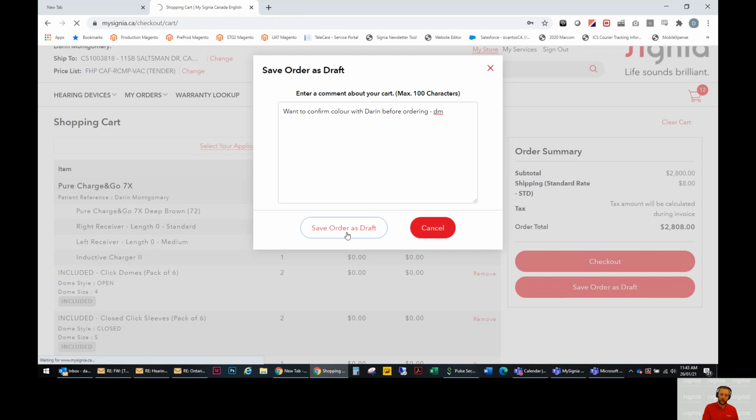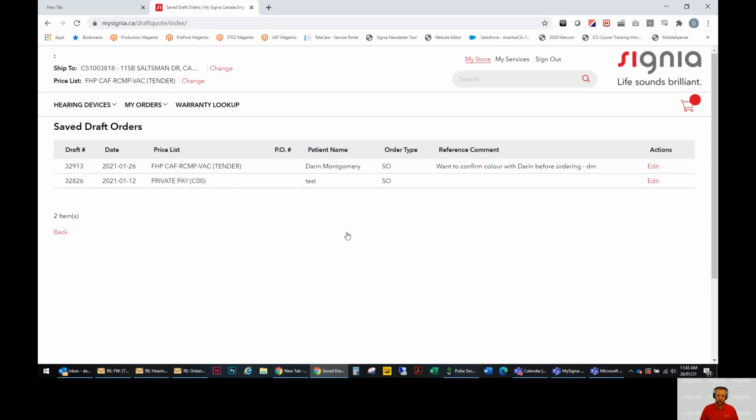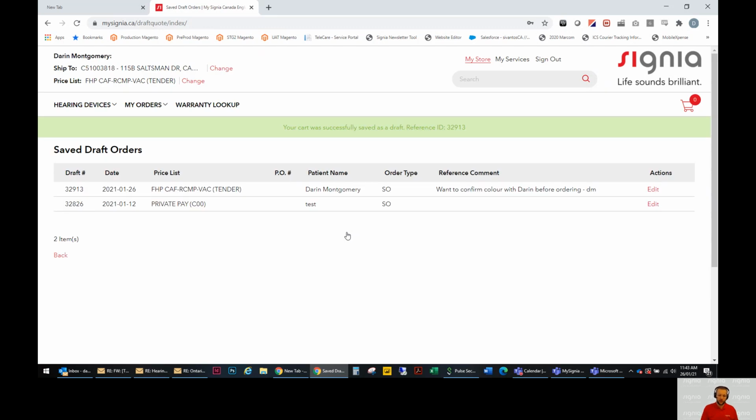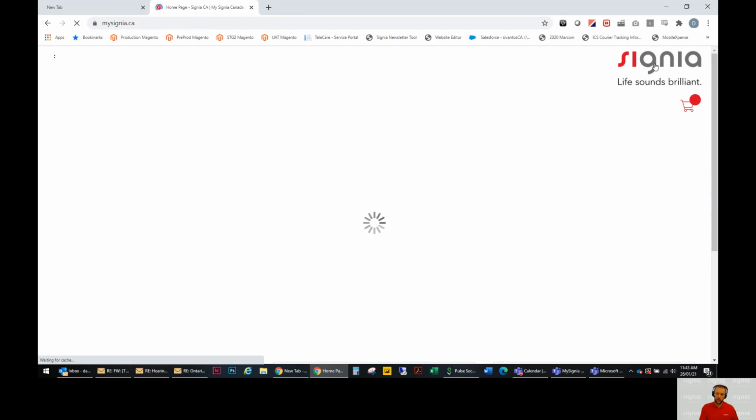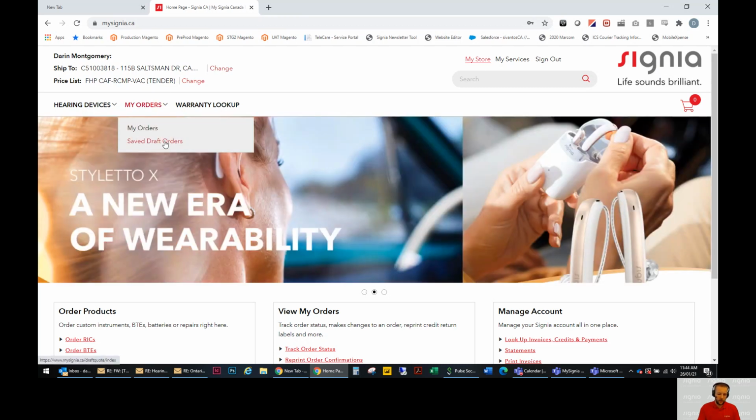Now you haven't wasted your time, especially if you've added an ear mold and you've made all of those selections. We just don't want to have you waste your time. So let's say you made that order yesterday, and today you have the confirmation that they wanted that deep brown, and you have logged into the system, and now you're on this home page. We're going to navigate to My Orders, and then Saved Draft Orders.